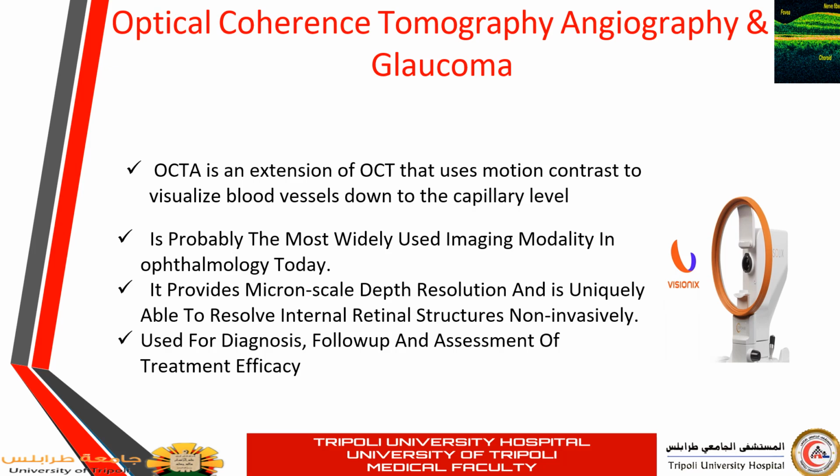And the evolution of OCT angio became feasible after the increase in the speed of acquisition of the image in OCT that made it possible to determine any moving particles within the retina, which are the red blood cells. So utilizing this option to give a motion contrast and give the impression of the flow. It is a non-invasive technique, useful in the follow-up and the assessment of the treatment efficacy.